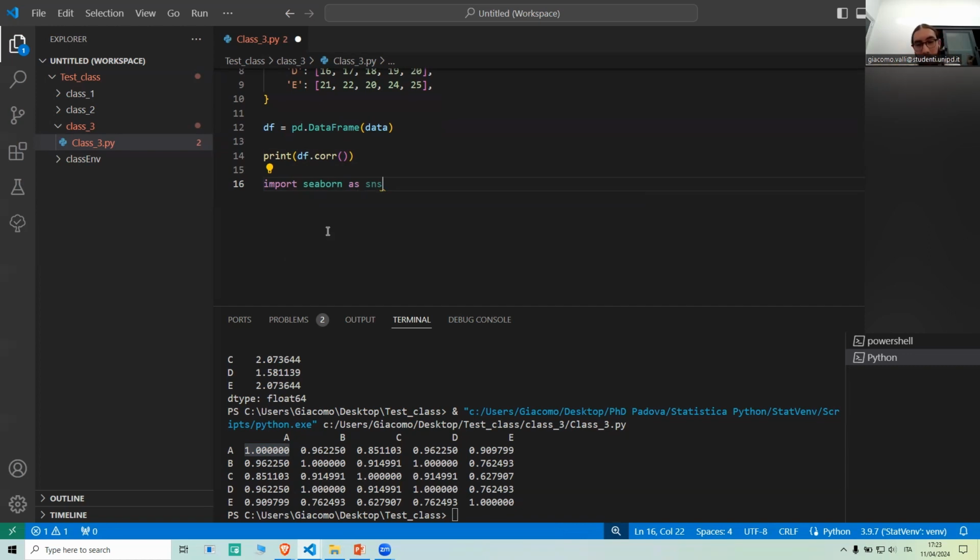It is built on top of matplotlib. That means that everything that you can do with seaborn can also be done with matplotlib. And usually basic libraries are always much more flexible, fast, and customizable. But on the other side, seaborn makes it much easier to perform the plotting of some, let's say, more complex things, because this library takes care of the processing.